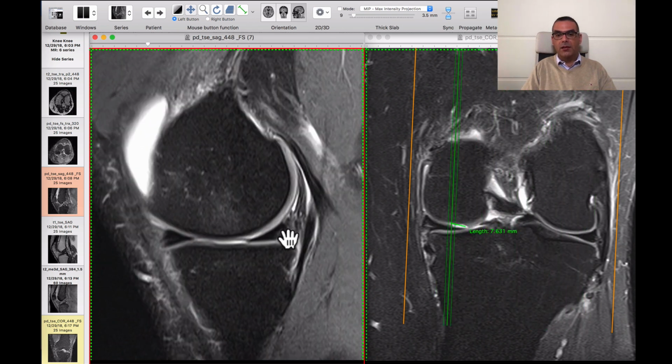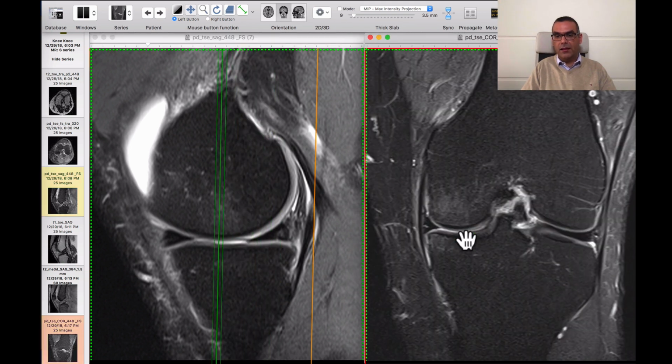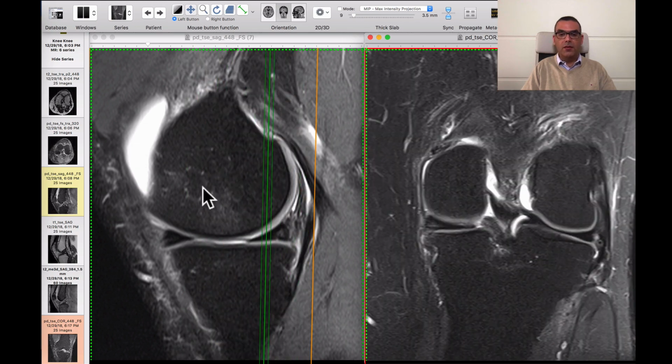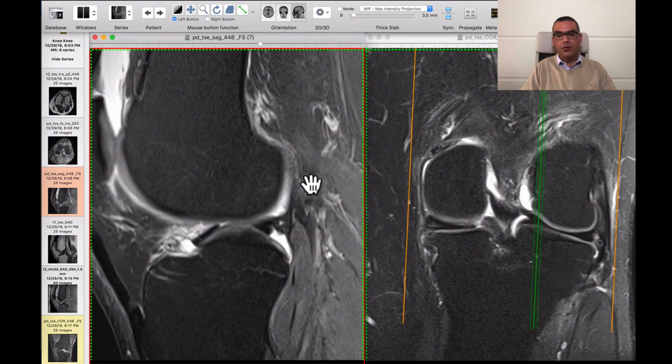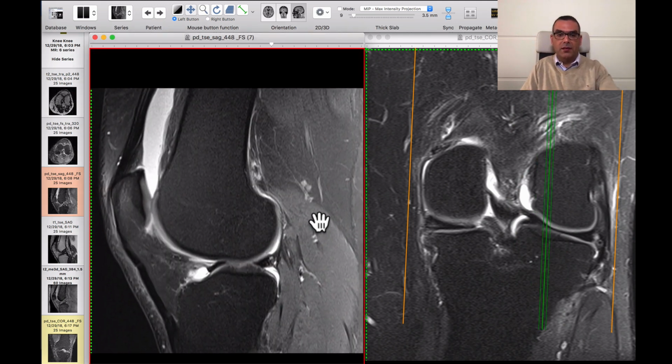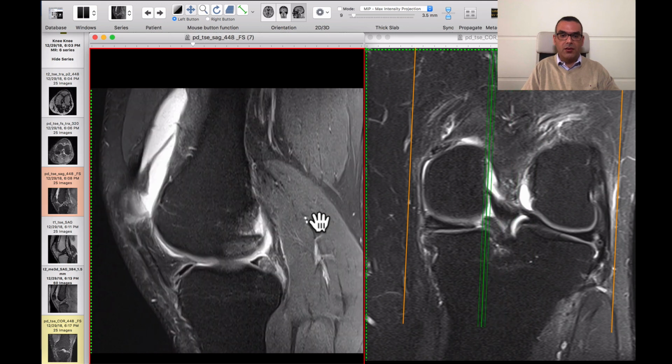Okay, so this is the medial meniscal pathology. As we said, meniscal degeneration, small tear and root tear, and the chondral ulcer beside the sprained MCL. And we saw in the axials there is an effusion and mild synovitis, as you can verify, of course, in the sagittal scans.